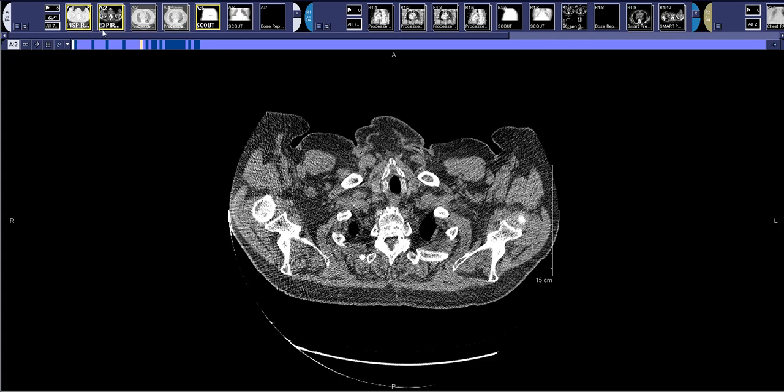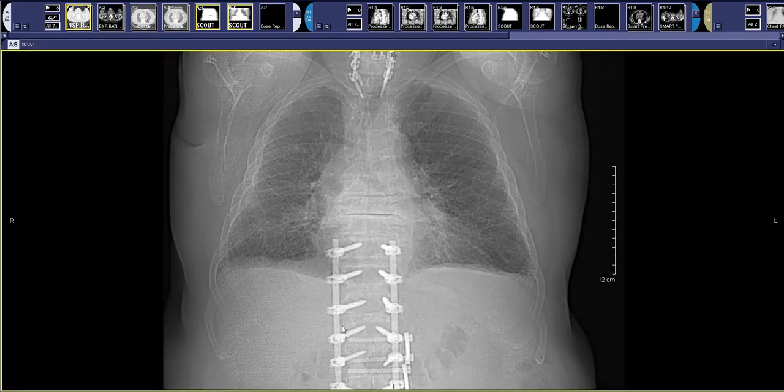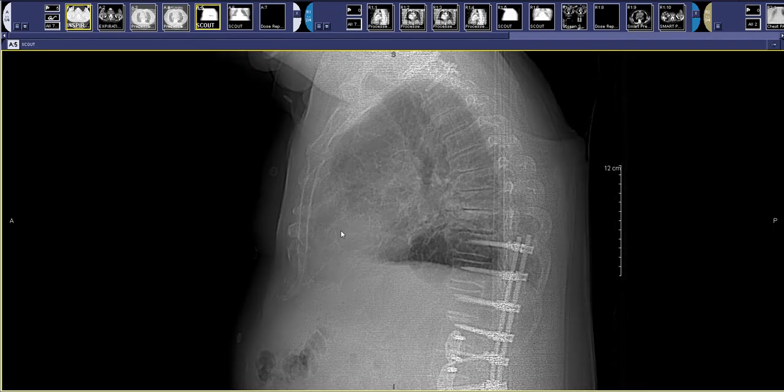So we have inspiratory, expiratory, and then sagittal and coronal reconstructions in our scout images, and that's what our high-resolution CT protocol consists of. I guess start out looking at the scout image. You can get an idea of what you might be missing in the lower neck or upper abdomen. The other things you ought to see better on the CT, but it's good practice just for chest x-rays to look at it, think about what you might say, but then move on and look at your CT.